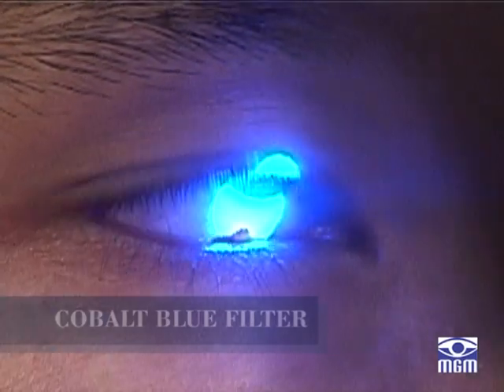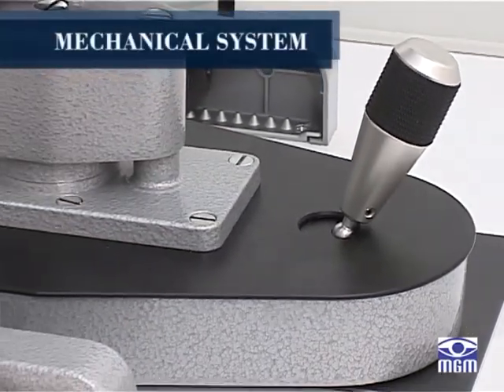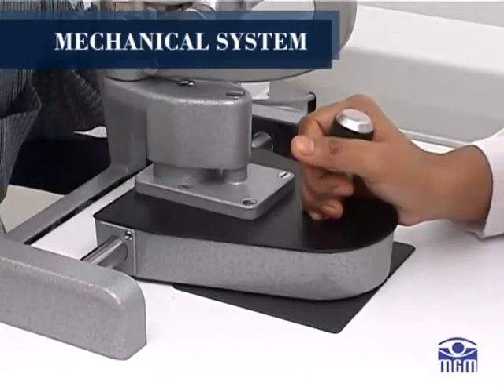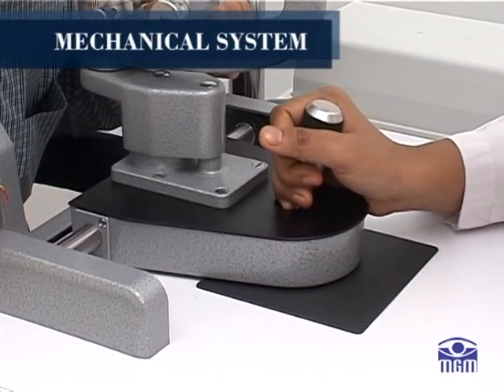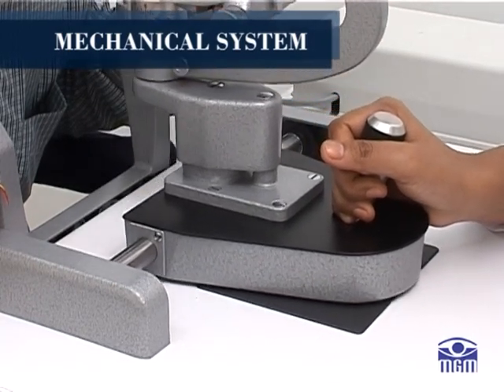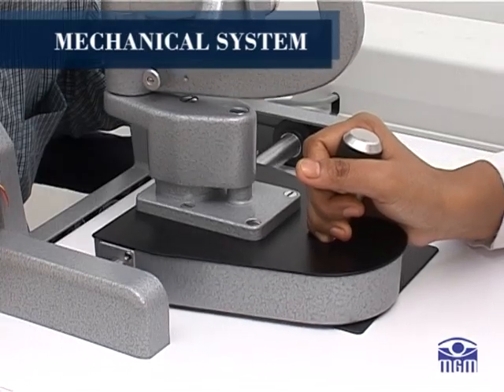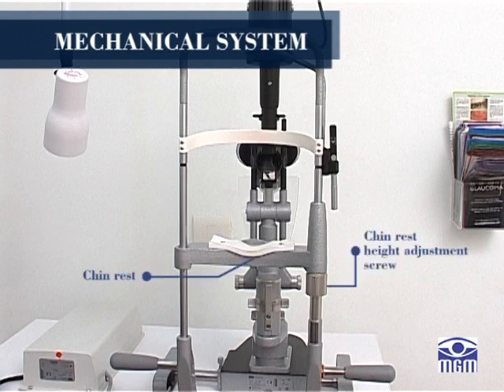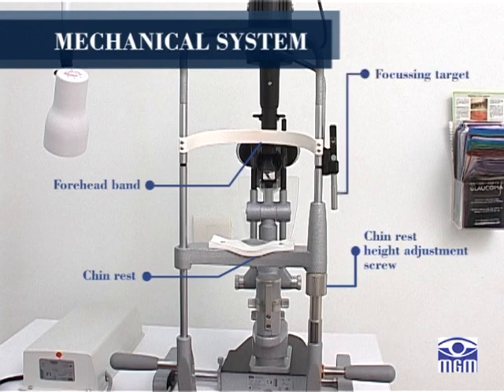The mechanical system consists of a joystick arrangement and a patient support arrangement. The joystick arrangement provides for movement of the microscope and illumination system towards or away from the eye or from side to side. The patient support arrangement consists of a chin rest height adjustment screw, forehead band, and adjustable focusing target.